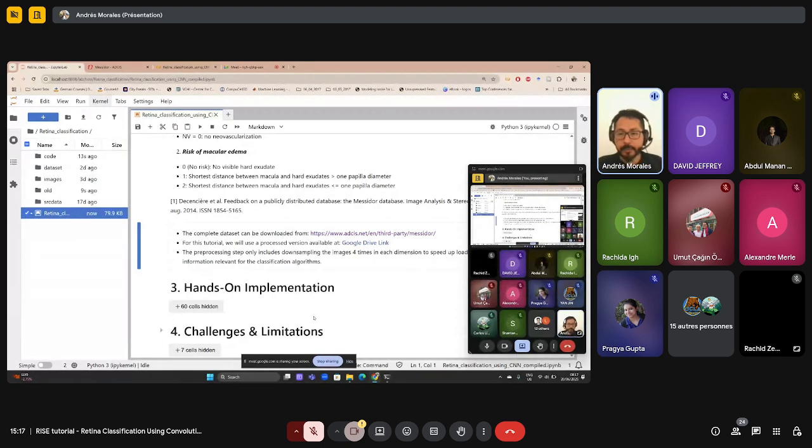So the images are relatively big. However, for the models that we will use today, we don't need all this super high resolution. To speed up the loading and downloading, so that you can also do this practice today, I already pre-processed the images, just downsampling 4 times. They still fit in the models and keep all the information that we need for this specific purpose.